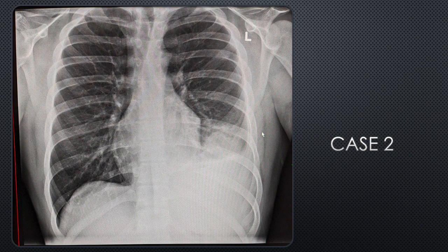Okay, so this chest x-ray is of the 17-year-old patient. Here on the left side you can see blunting of the costophrenic angle, indicative of an effusion on that side, with a left lower zone circular lesion versus consolidation, but because of where it is and what it's like, it prompted a cancer alert, and this was then done and CT'd.